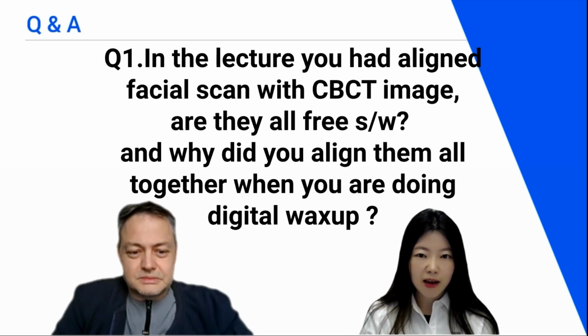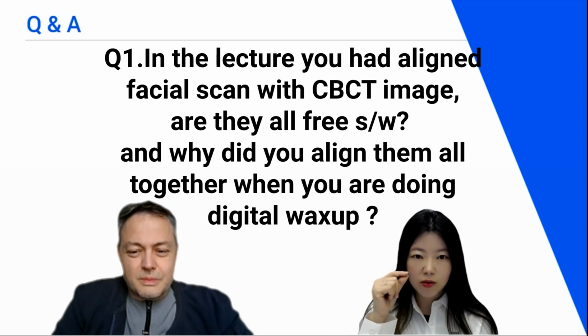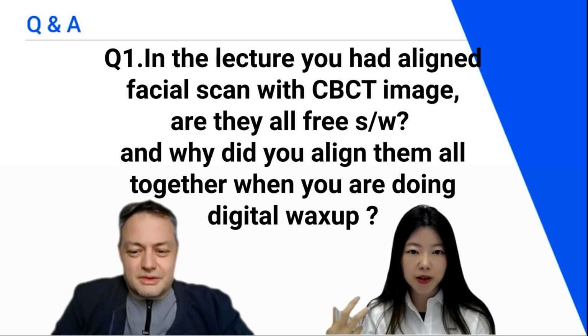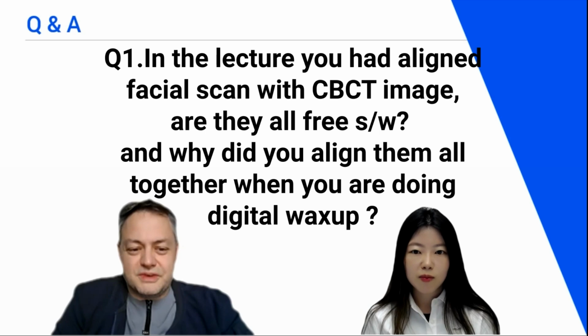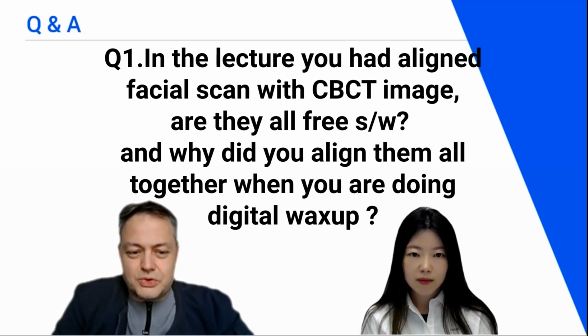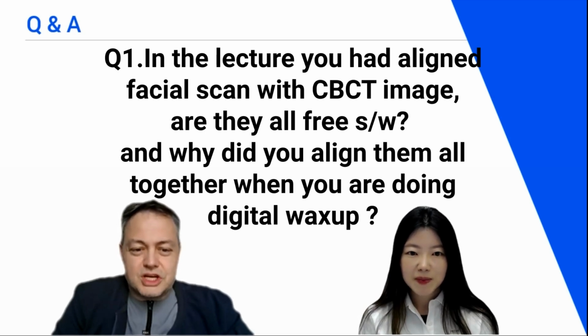With the CBCT data, you can see the root angulation or flange or the bone resorption and things. So these are very helpful for doing digital wax. That's what you mean? Exactly. It's very beneficial to see where the roots are, to know where the bone starts, because when you open a flap to do a crown lengthening, you will want to know if you just cut the gingiva or you are going to actually do also some bone remodeling.